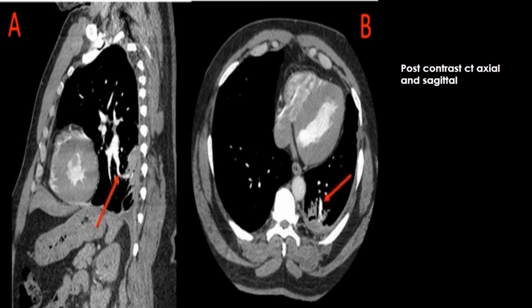These are images in a patient with asbestos exposure, taken in the sagittal plane and the corresponding axial images. These are the post-contrast images, where you can find homogeneous enhancement of the tissue, together with contrast-opacified vessels moving towards the parenchyma, which is consistent with round atelectasis.